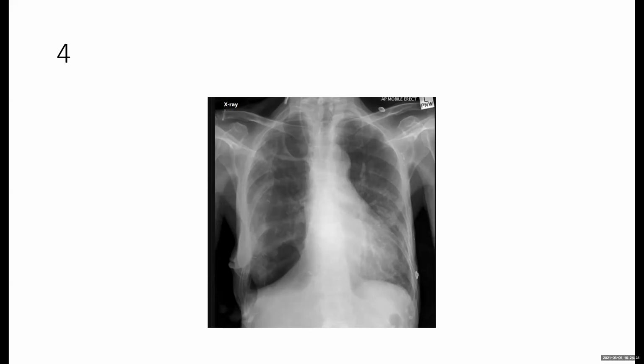Okay, so maybe I can skip this case, or you just want to go for this? No, go ahead. It's okay. Well, I can see a central line in this patient extending down, but I can't see the end of it. There is no specific findings in the thoracic cage, but there is no pleural effusion.